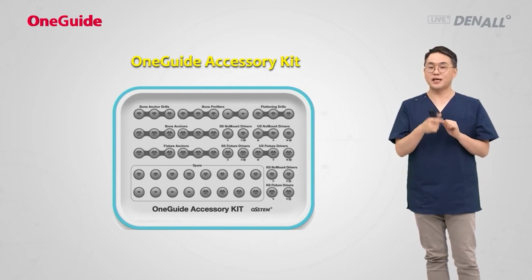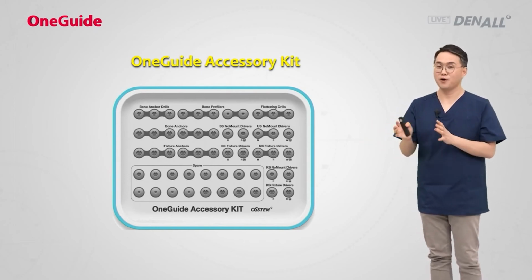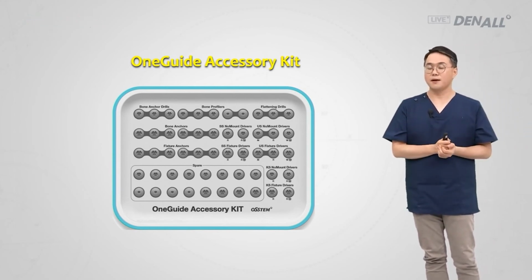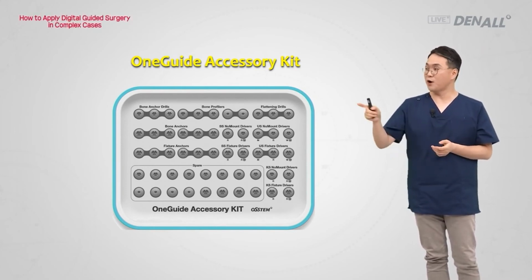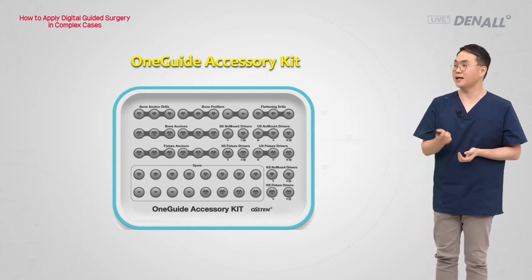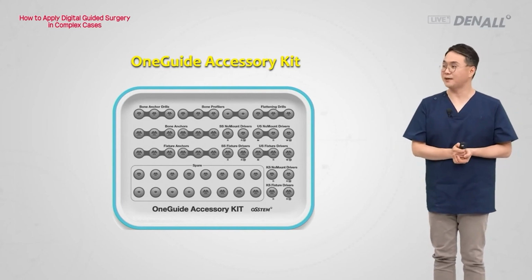For myself, the flattening drill has multiple blades, and after the grinding of the cortical bone, the bone can get stuck in the blade. It's hard to remove that bone, so I prepare some more flattening drills in this kit. If you believe 3 anchor screw rods are not enough, you can include more of those here. So depending on the surgeon's preference, the kit can be customized.